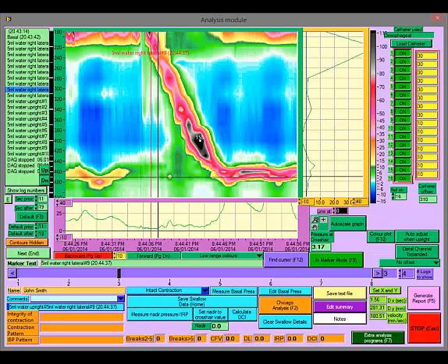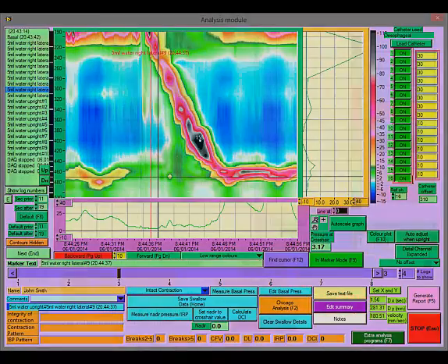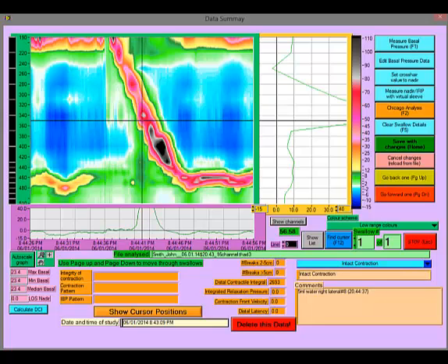If you wish to view the data you have saved so far and perhaps make some changes to it, you can access this through the Edit Summary button, which will bring up this screen, the function of which is described in detail elsewhere. Make any changes and then press on Stop to return to the analysis screen.